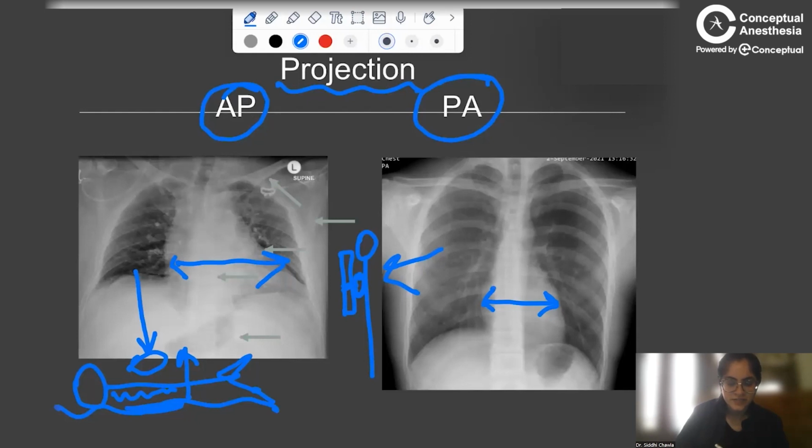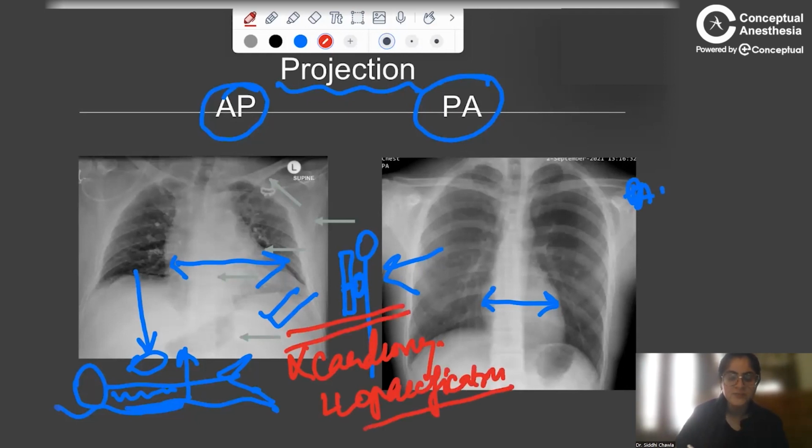The other side effect of this is basically the vertebra. The vertebrae are better seen in a PA view, because they are magnified, right? So these are the types of projections that you should keep in mind. You should not label these X-rays as improper, as you know, with cardiomegaly, there is no cardiomegaly. And this lower lobe opacification is also commonly seen as a spurious finding in the AP chest X-ray view. But obviously, in an ICU setting, you cannot avoid them. But you should know what the drawbacks of it are. You just cannot label every patient as having cardiomegaly, right?